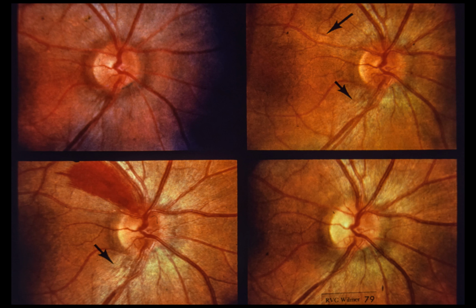Lower right. 1 year after the onset of visual symptoms in the right eye, and 20 months after the onset of visual symptoms in the left eye, visual acuity is 1/200 right eye and 6/200 left eye. The right optic disc shows marked temporal pallor. The previously observed telangiectatic peripapillary vessels have disappeared.